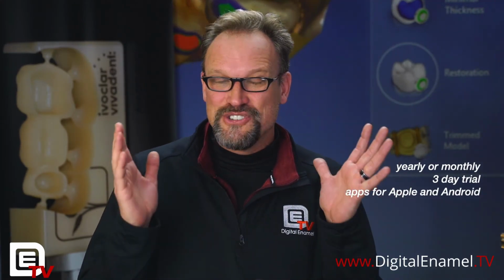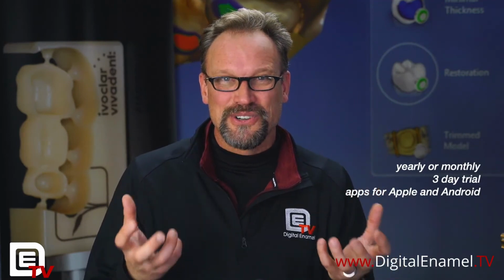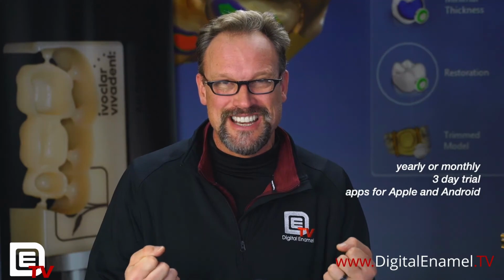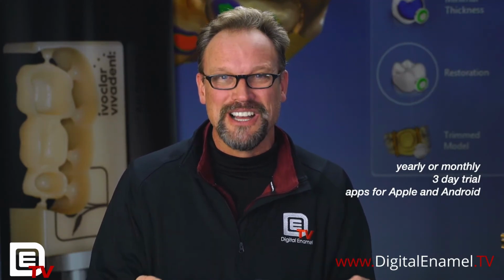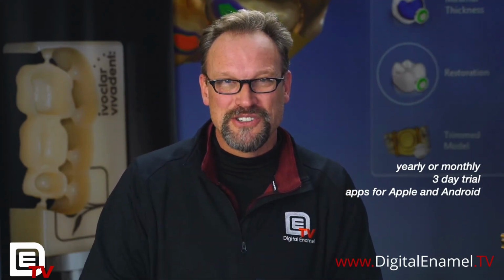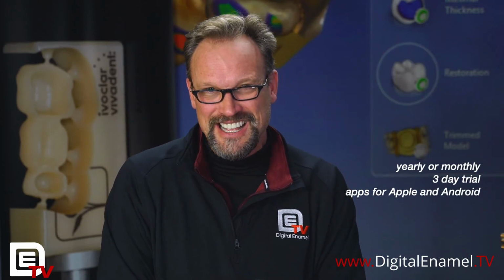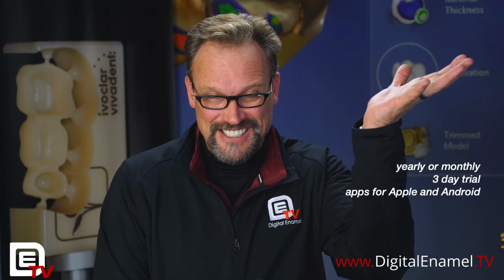And don't forget to save your process during CEREC, because you can never save too much. When you're doing multiple anterior units, you'll thank me as you save them along the way, which I've got tons of videos on that as well on DETV.